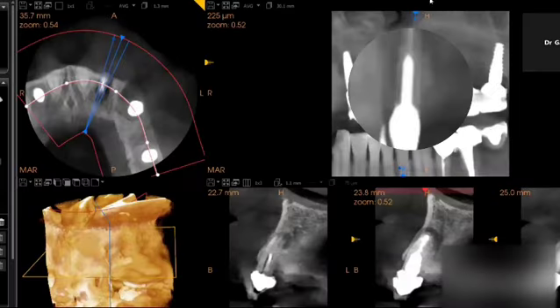Hi guys. Seeing this tooth, have you ever wondered why the patient came for removal of this tooth and for implant placement? Now, to answer this, let's go and have a look here. So, this is a tooth that is the lateral incisor.